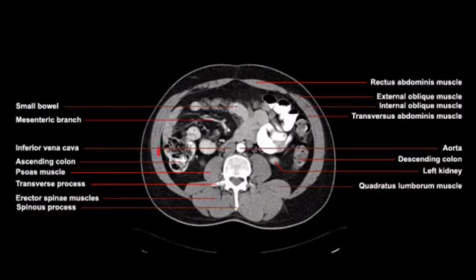At this stage, the ascending colon is very large, and that's because it actually starts at the cecum. The cecum is a very large saccular structure, which is the beginning of the colon, and we're starting to get close to that area. All of these loops of indiscriminate tissues, this is all portions of the small bowel. And you can see that some portions of the small bowel have been filled with contrast, while other portions of the small bowel have not been filled with contrast. We can still see the descending colon here, and again, this is the ascending colon.